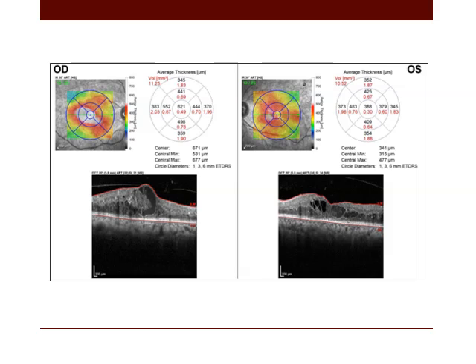The most important ring in decision of treatment and follow-up of therapy is the central subfield ring, which is the central foveal ring. We can also use the central thickness, which is a point extending from the retinal surface to the central fovea in this scan. Again, this is the central macular thickness point at the center of the scan over the center of the fovea.